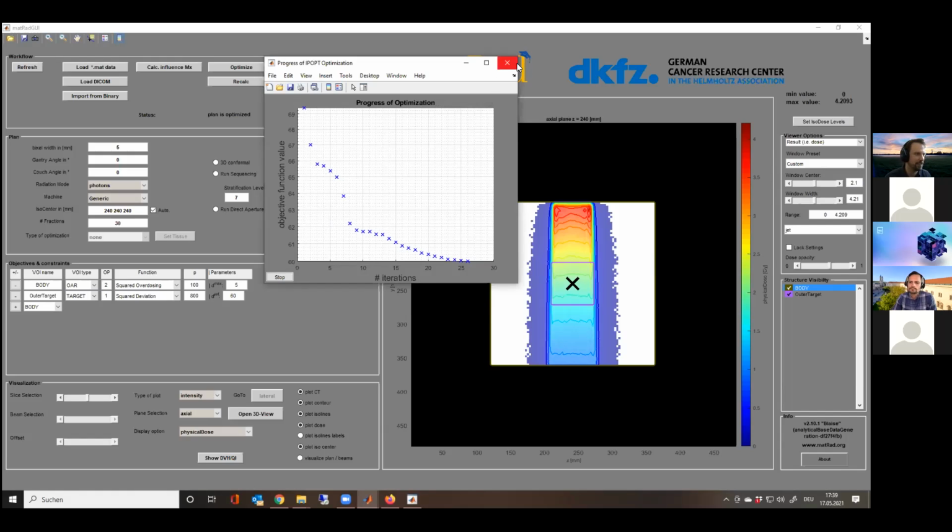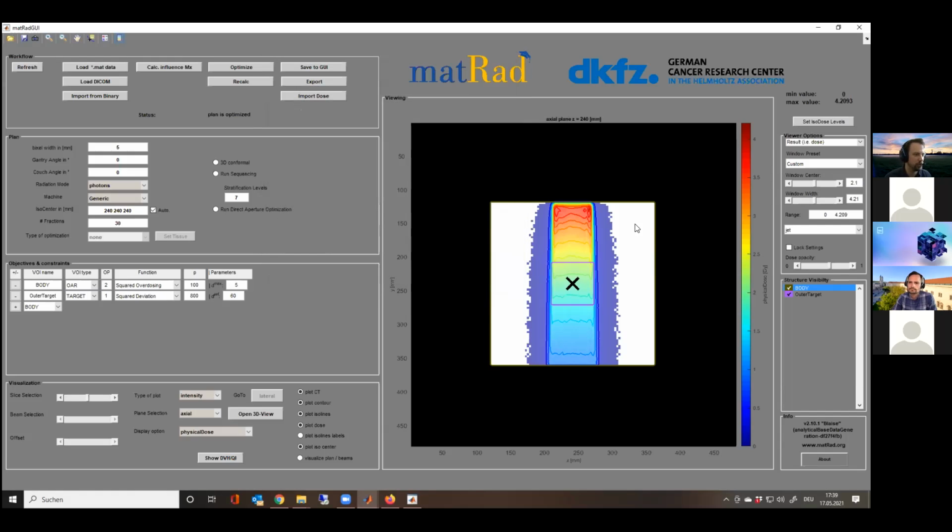And you should end up with a dose. And this is a photon dose. It looks quite obviously like a photon dose. So it has a high entrance dose and then the exponential decay. So red is high, blue is low, then an exponential decay throughout the water phantom. The same, or something quite similar, you would see on another patient, or on a prostate, on the TG119, on liver, I don't know.